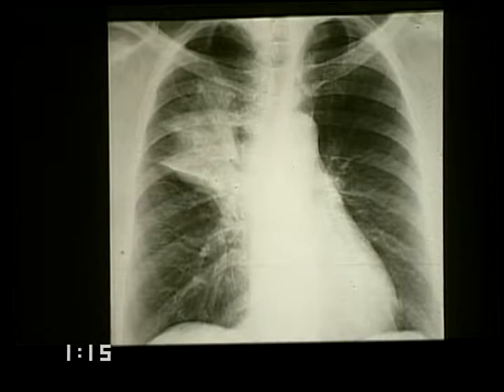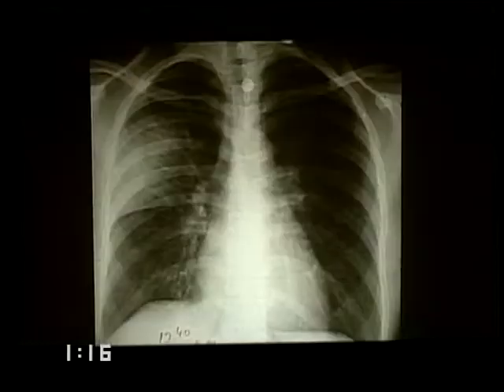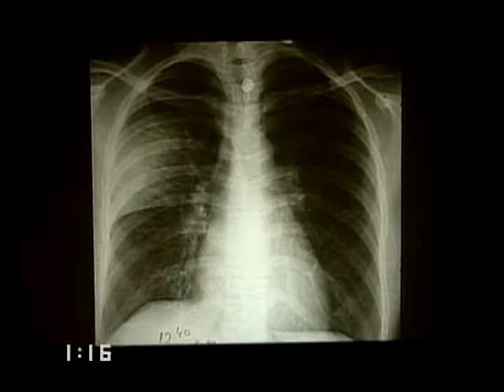This is a classic example which has been recorded for more than 2 generations in the radiologic literature of a lung cancer. It is only unusual in that this happens to be a bronchoalveolar cancer, and they typically do not reduce lung volumes. So an example of a fluid, pus in this case, or exudate, and cells producing airspace opacification.